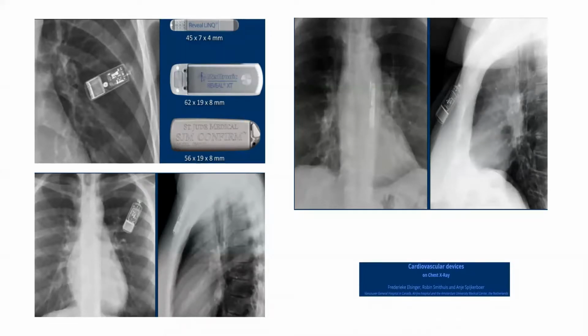They have good storage memory. So they record, especially when the patient is having symptoms. You ask the patient to press a button, and the ECG is recorded before, during, and after this event, so you can interrogate and see what kind of arrhythmia the patient is having during the period of his symptoms. So this is a loop recorder. The one we usually use is Reveal, which is this one here, and it's put here. These are all acceptable sites and locations for the Reveal device. So whenever you see something like this, remember the loop recorders.